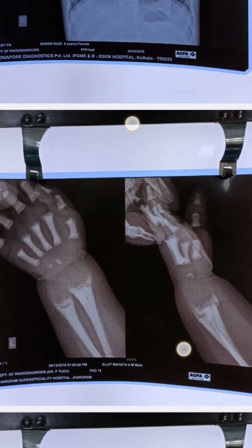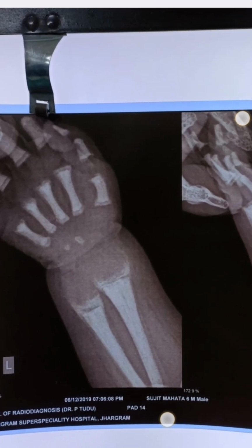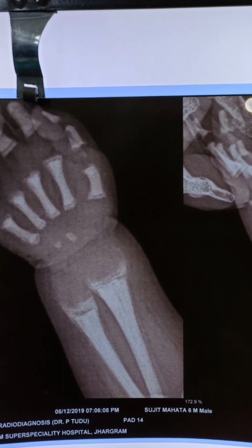Now in this sciagram, you can see that there is cupping of the metaphysis. Now what do you mean by cupping? When the osteoid tissue at the metaphyseal end is non-calcified or poorly calcified, it is very soft. So due to the pressure of the long axis of the bone, this soft osteoid tissue bulges outwards and there is widening of the metaphysis. This widening is called cupping.